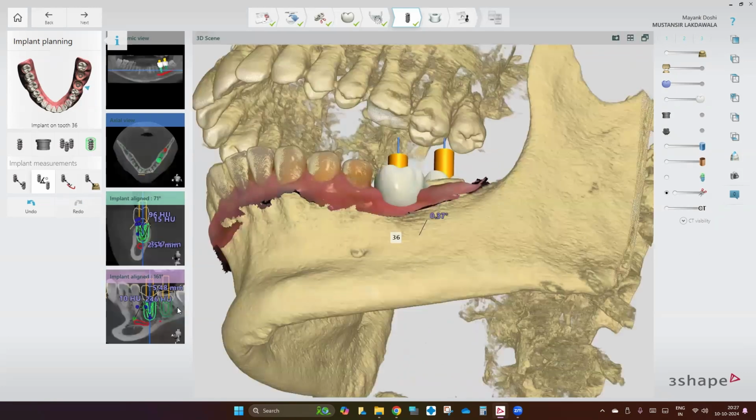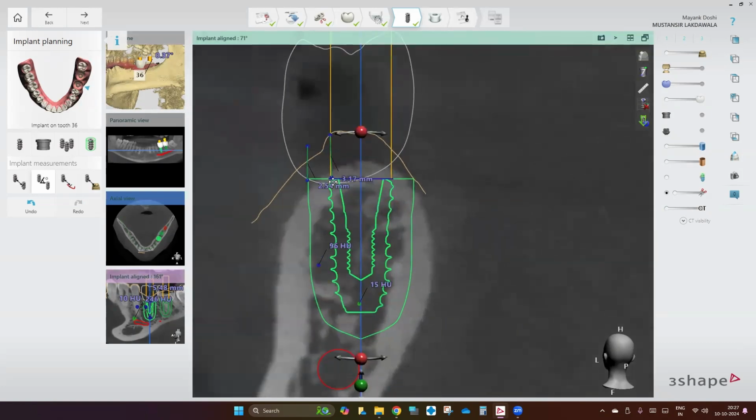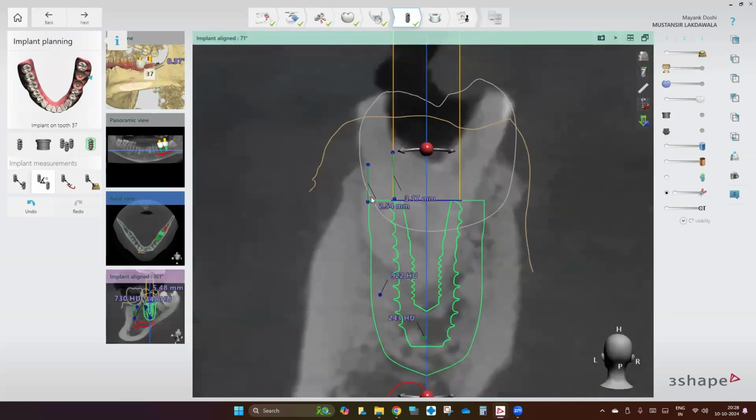One last check before I go. Cross section. So this is which implant? This is my 6. I am about 3 millimeters away from my soft tissue, which is where I want to end to establish the biologic width. In this case, I don't care about anything else. Decently centered. If I would have wanted, I could have actually tilted it mesial or buccal, but otherwise prosthetically it looks okay. So let me go ahead and select this implant. Come back to cross section. I am about 2.5 millimeters below.